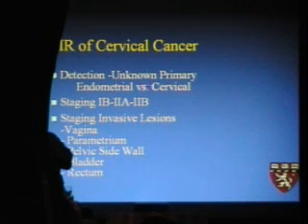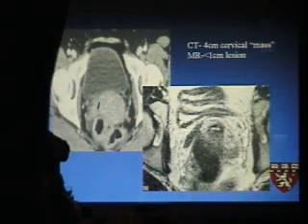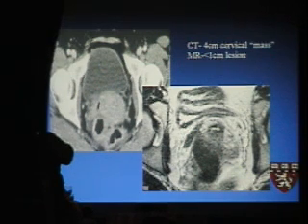to tell whether it's an endometrial or cervical primary, but most of the time they're already biopsied, they're coming in for staging evaluation. And our role is really to tell them how big it is, first of all, because size has become incredibly important in cervical cancer. They will not operate anymore on someone who has a mass greater than 4 centimeters. So your size, and you are the most accurate.